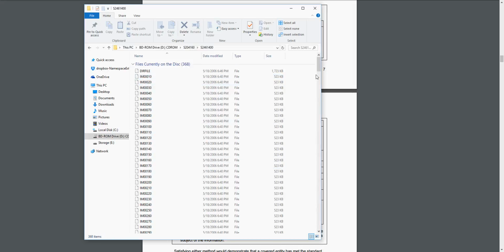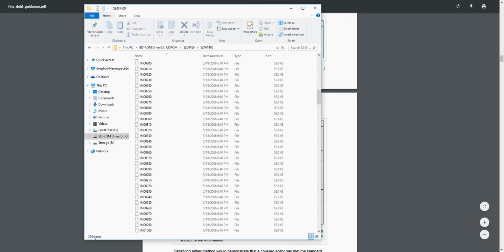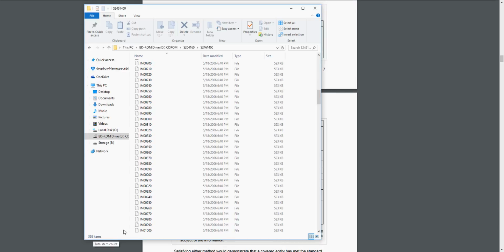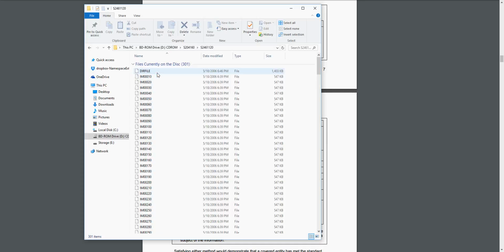Sometimes it can be difficult to figure out which one to use. One rough way of doing that is just to find the one that has the most slices or files in it. Also, they don't always have an extension .dcm. That's the typical extension, but that's not always the case. Certain programs require that extension to load in the data. Extensions are really just for Windows computers, but it's pretty common to have. That can be a problem with certain programs.